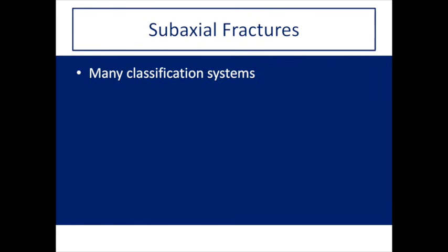Another common way to describe these fractures is by mechanism: flexion compression, pure compression fractures, flexion distraction, extension compression, extension distraction, and lateral flexion. On top of that, there are also various eponyms such as chance fractures that are used. You can probably already see why people find it exceedingly difficult to describe and classify C-spine fractures when you first start.